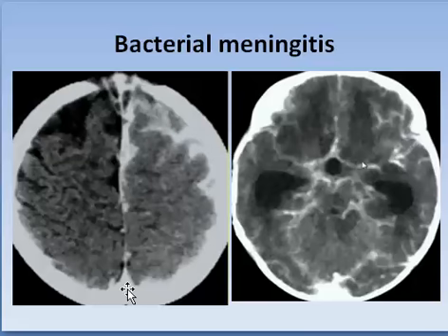It is hemicerebral, and then here it is involving all meninges and resulted in obstruction of the exit foramina. So we have hydrocephalus. This is enhancement in all meninges.